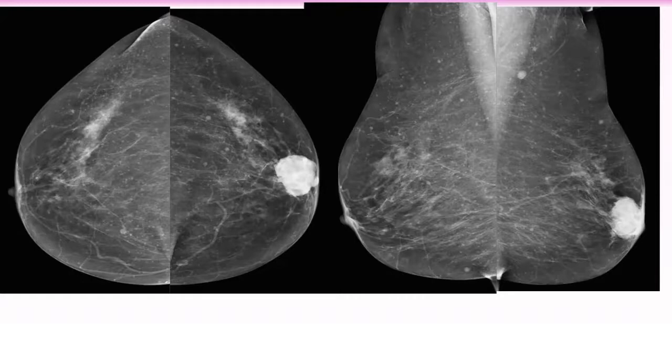No. You mean you are thinking about cysts, about fibrocystic change? But why do you think about fibrocystic? Can you characterize this lesion more?